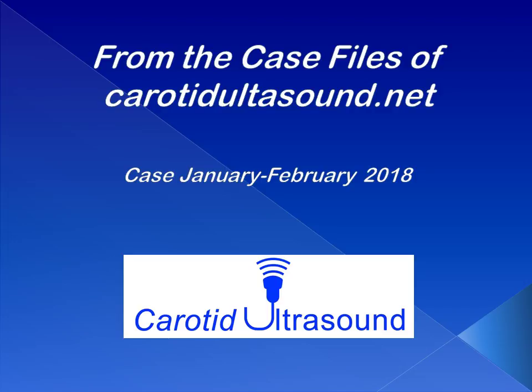We have an unknown case today, and I'm going to show you the ultrasound images. I want you to come up with a diagnosis, and then we are going to review the images together.